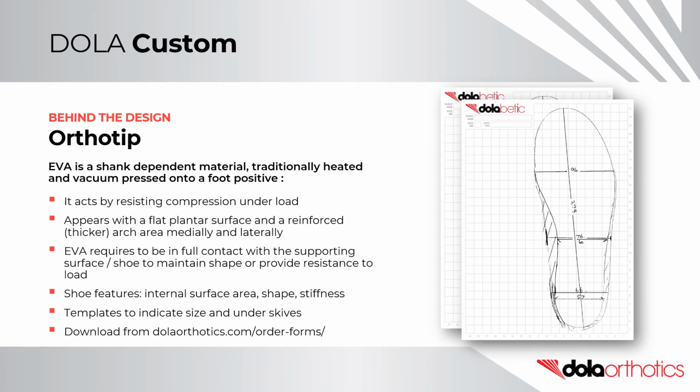Dispense of EVA orthotics can involve some grinding to ensure the orthotic sits flat and stable in the foot shoe bed. If you want the lab to do the work for you, send a template using the DOLA grid for easy fitting direct from the packet. Mark the underskives or shape of the plantar surface grinds on a template and we'll do the hard work for you. The template is available at the link listed.